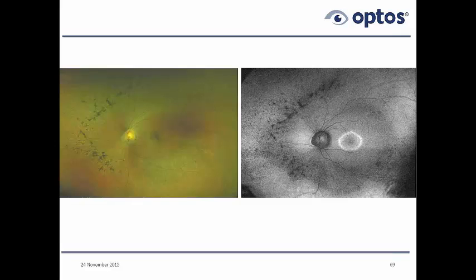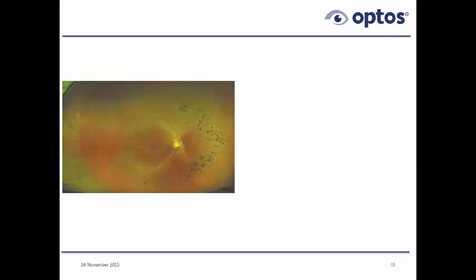So here, additional information is being gained. The smaller the circle, the more problem the patient has. This is active. This will typically increase towards the fovea. So in a few years, this may actually wipe out the fovea. This patient would be much better off if the lesion was this big. So we have patients with retinal degenerations that sometimes have large rings. This patient doesn't have a large ring, may develop one perhaps, but the smaller ring suggests that the macula is actually sort of threatened by this lesion.